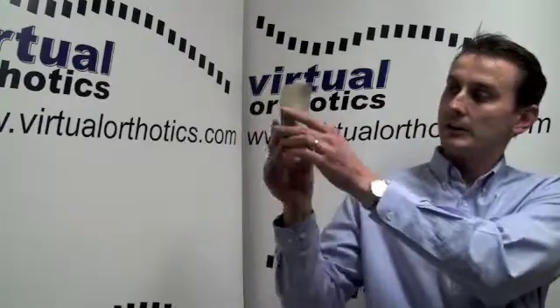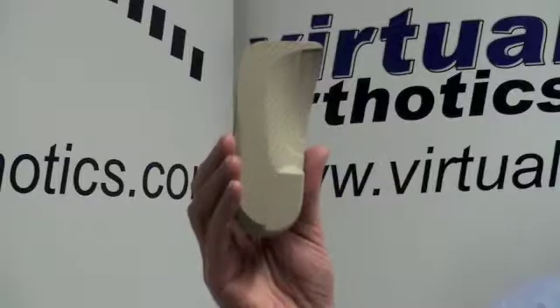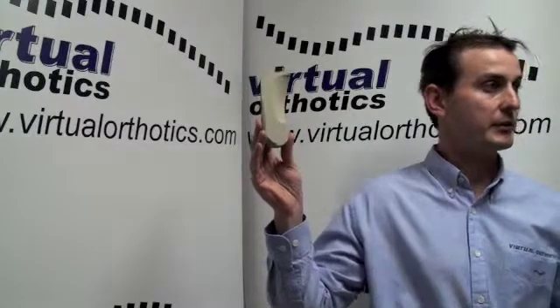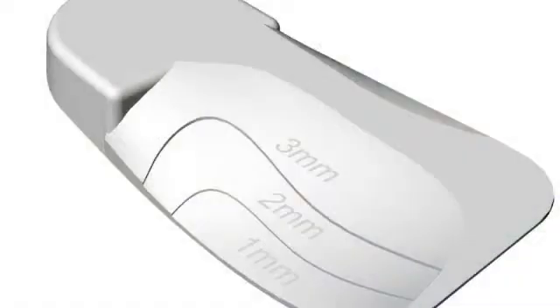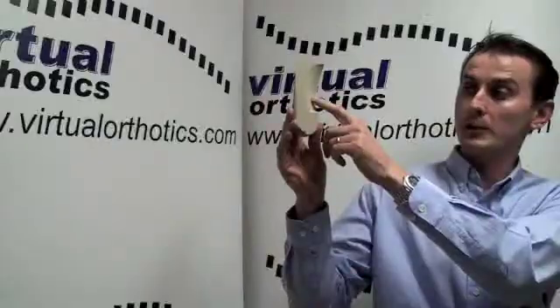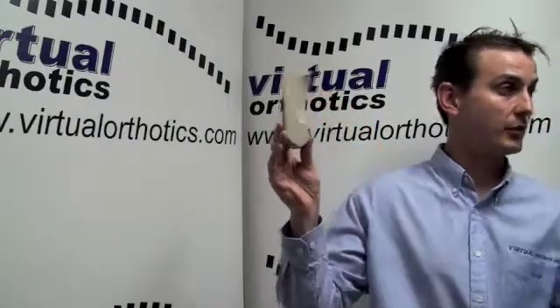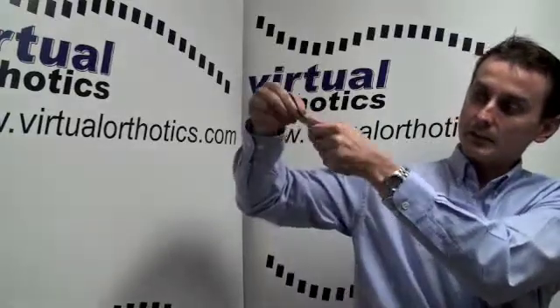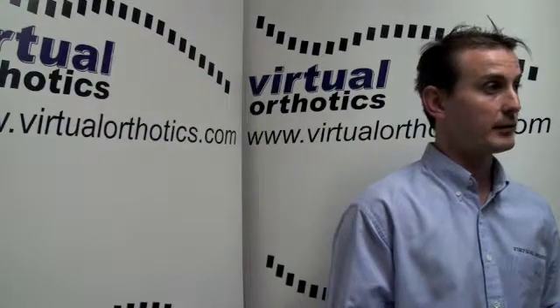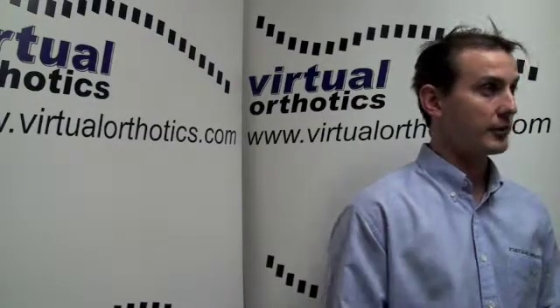What we've got here is an orthotic that's been made via the CAD-CAM process. You can see on the bottom surface here, you've actually got 3 different levels of thickness. This might be useful in a situation where you might need increased plantar flexion of the first ray. So what we've got here is a 3mm thickness going down to 2mm and a 1mm graduation as well. You can actually see that this is a little bit more flexible than a traditional 3 or 4mm polypropylene might be using the traditional methods of manufacture.